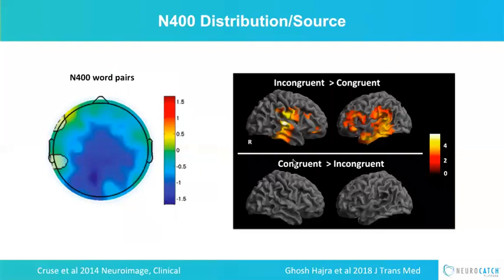What you can see here is we know in general that language tends to be, particularly for right-handers, left hemisphere organized, so it's stronger in the left hemisphere. And you can see the classic language areas using not only the temporal lobe, the primary auditory and the inferior temporal lobe, but also the posterior temporal and the interface with the parietal lobe. So this is Wernicke's area for those who know that concept. And you can see that it's also extending into the frontal lobe, into Broca's area for expression, and the dorsolateral prefrontal cortex. So an extremely classical language presentation for neuroimaging for the N400.